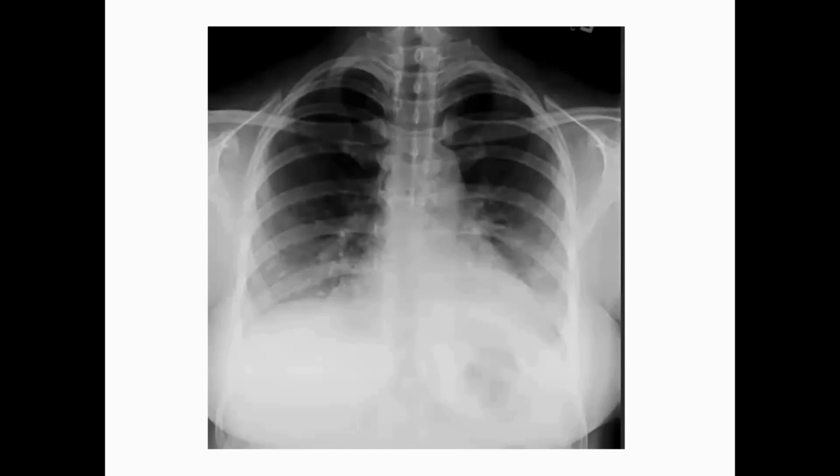The patient looks very unwell. But despite that, the chest X-ray is not that severe when you correlate it clinically. So this is one thing, the clinical feature.